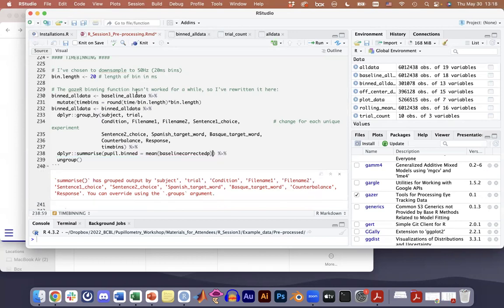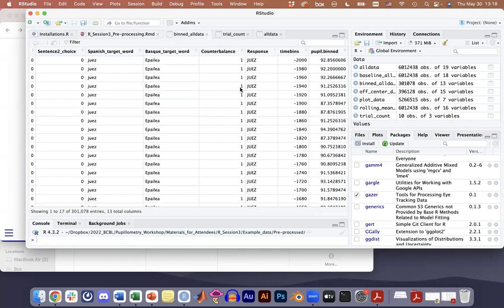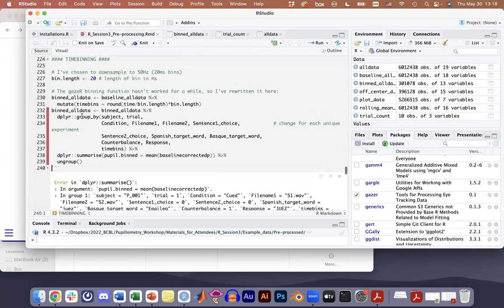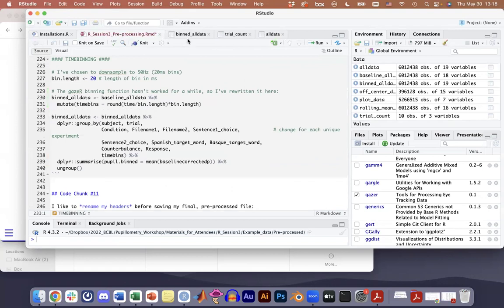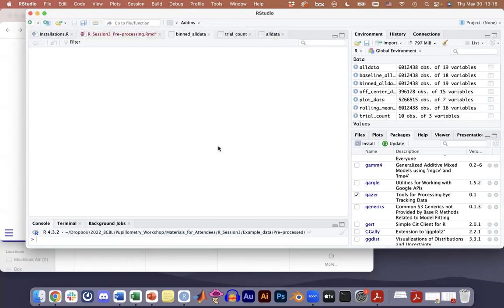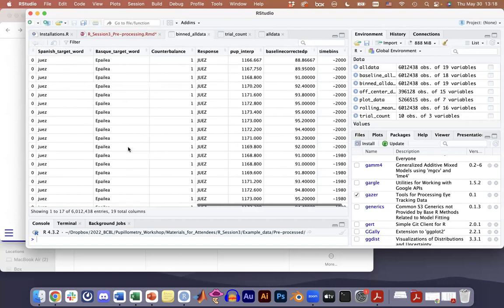So that's when it's averaging across the 20 time points to create just one bin. Yeah. Okay. Yep. Can you show again the renaming? Yeah. Oh yeah, I guess I have to back up if I'm going to do that. So if you just run this chunk. And actually it sort of looks like, so this is -990. So the first bin is actually not 20 units being taken as a mean. So a small note: your first time point is actually a 10 millisecond bin, which I've never noticed before.